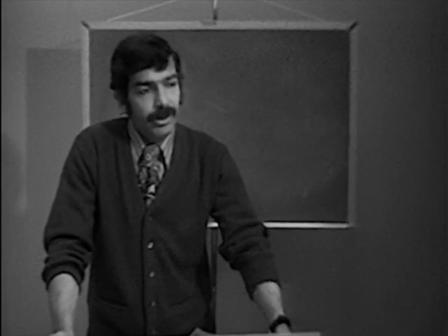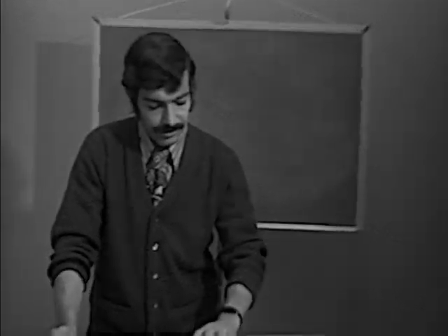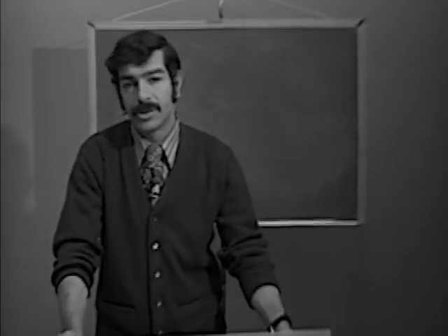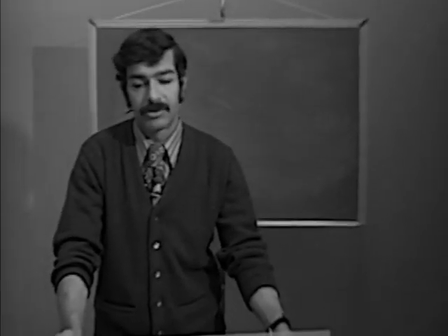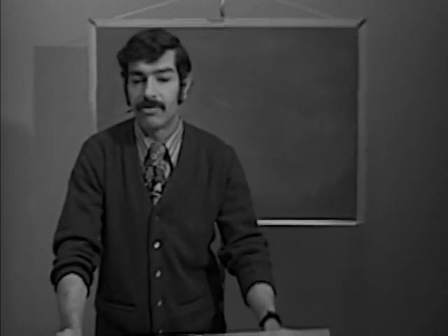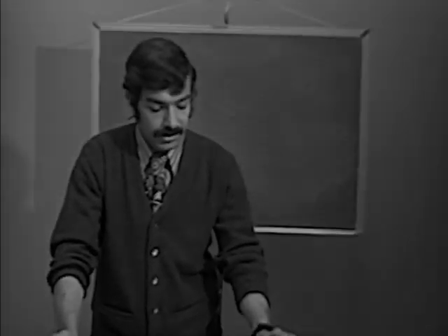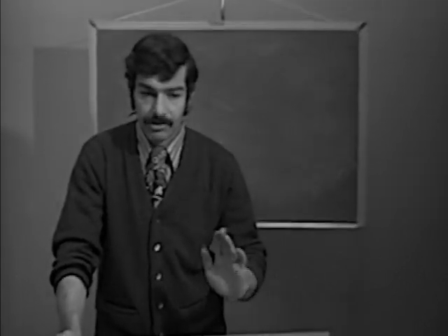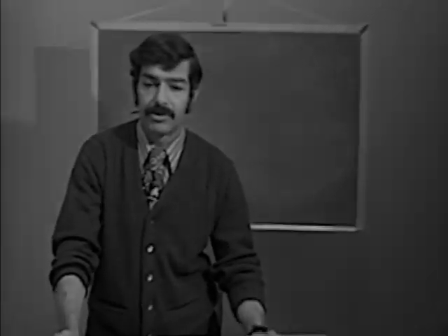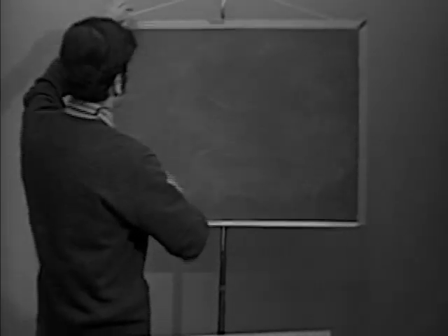All right, now let's talk a little bit about axis derivation. This is another very important routine thing that you will do in the interpretation of every electrocardiogram, determining axis. There are ways in which you can determine axis very accurately, but for clinical purposes this is really not necessary. So what we want is a reasonably accurate method which can be done quickly. You can't spend a lot of time figuring out what the axis is.